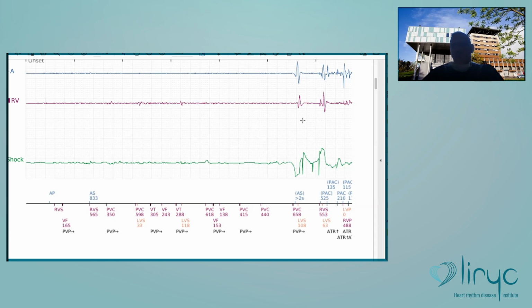I know that these tracings are coming from a single center where they program a monitor, or sometimes they do not deprogram the ICDs at all during the surgery, so monitor plus therapy. And so when I have a look at all their tracings, I could see many of these kinds of tracings, so very flat, during cardiac surgery, and then the use of the electrical scalpel.